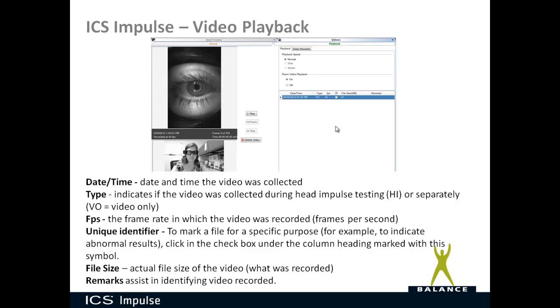All these videos are stored in a video folder, and they're all identified uniquely, so they're easy to find if you went into that video folder. But the thing is that you could be taking up a lot of space on your hard drive by saving all these videos. So what I would recommend is, if it's not important, delete it after you do it. And that'll save a lot of your hard drive space.